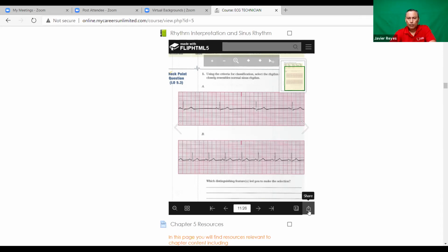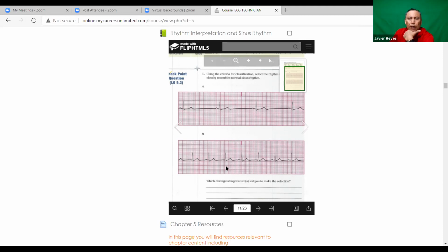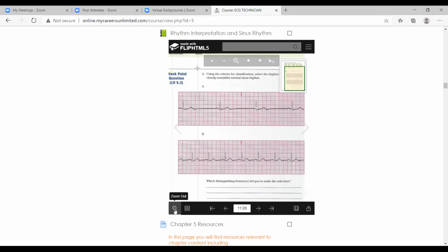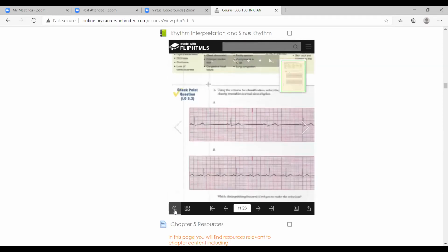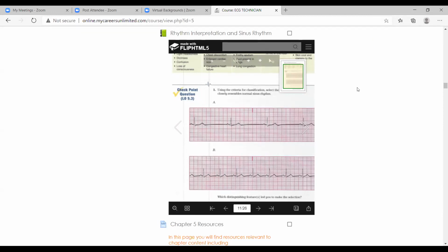I'm trying to make this bigger. I don't know how to count the little squares. Are you looking at my pointer? Right here in the middle of the page? Super small. Can you zoom it in? That's what I'm trying to do, but for some reason I can't. Make it full screen, sir.